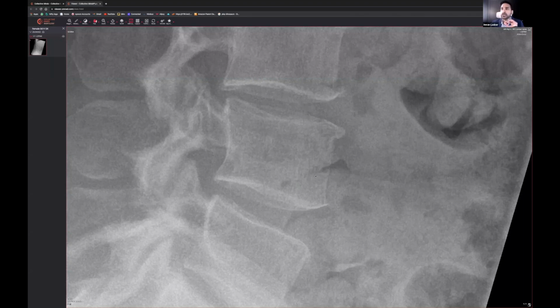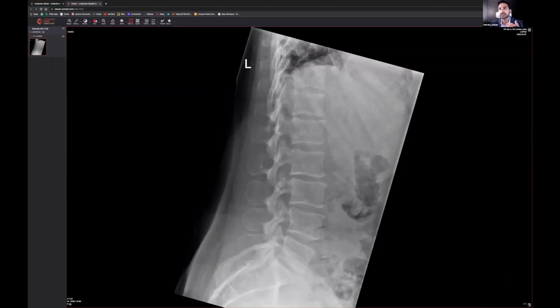Thank you very much. So what you do is go forward, and you can see that this radiolucency goes beyond the cortex of the vertebra, and therefore this can't be a fracture, because the radiolucency shouldn't go beyond. What we have to remember is that you've got a lot of overlying bowel gas, and you can see overlying bowel gas over here. Again, on the next bit, you can see that there is some osteophytosis emerging from the anterior superior corners and the anterior inferior corners of the vertebra as you go along.